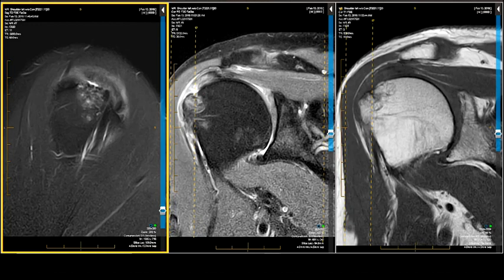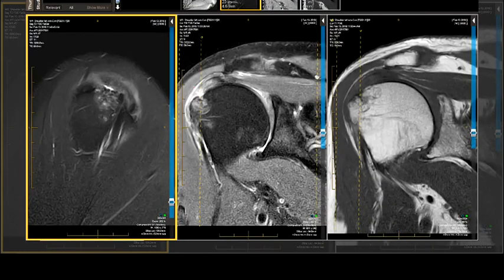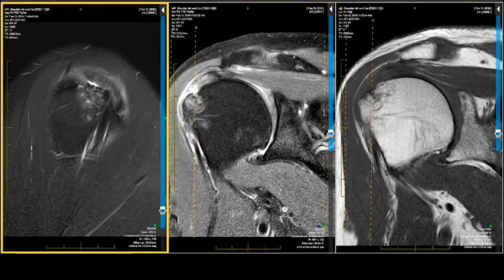Next paragraph. The tear is 3 millimeters wide by 7 millimeters long and lies just behind the most anterior fibers of the supraspinatus, surrounded by areas of interstitial tendon fiber swelling and or failure. In other words, where are all the tendrils, the subtendon units that are supposed to be in here? Where are these? They're effaced. So this isn't the only area of pathology. That's just where the tear has coalesced.